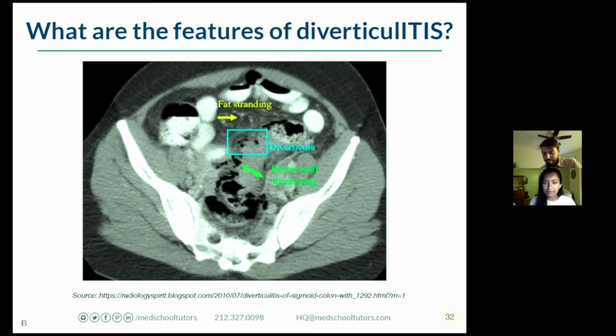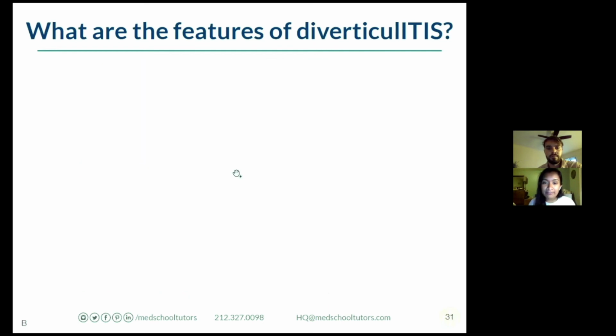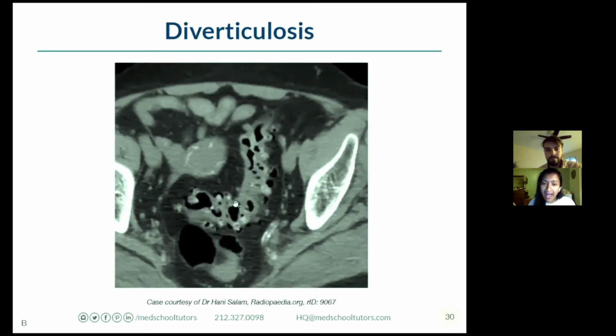Sana, yeah, definitely. The thing that's most useful to me, and this is a generic thing I used more before I was a radiologist but still use very much now, is: does it look like a mess, right? So here, when I'm looking back at this image initially, I can very clearly trace the outline of the bowel, and I can trace the outline of every single diverticulum. It's very obvious where it ends and where it continues and where the mesenteric fat is. And so this, to me, is just plain old diverticulosis. There is no inflammation because there's no hazy messiness around it.